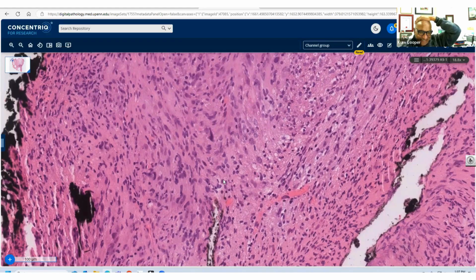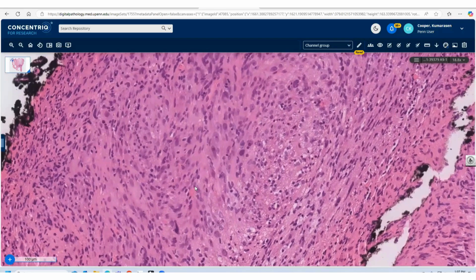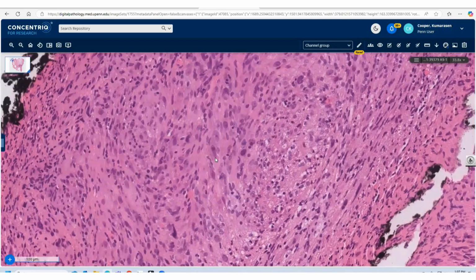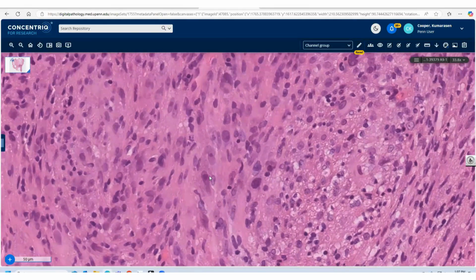Well, so I think this is clearly a cellular lesion. It's a younger guy. I think with those pleomorphic cells, some of them have kind of this vacuolated cytoplasm as well. And some have prominent nucleoli. So if he's 29, I mean, to the scalp, I guess you have to rule out a melanoma because common things being common, and I also, now that I live in Texas, everybody has some kind of weird melanoma here from being out in the sun.